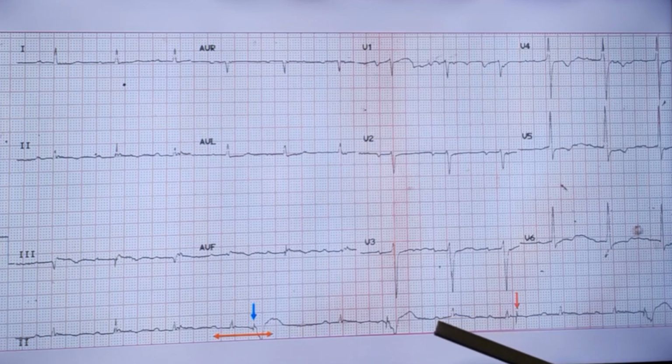You know, the temporary pacing lead is just placed in the right ventricular apex, and when the person moves or coughs or something like that, the lead can get displaced and move into the right ventricular outflow tract where it will be floating. It may not be touching the myocardium. In that case, there could be sensing function abnormality as well as pacing function abnormality. But here we have definite evidence of sensing function abnormality or pacemaker sensing failure.